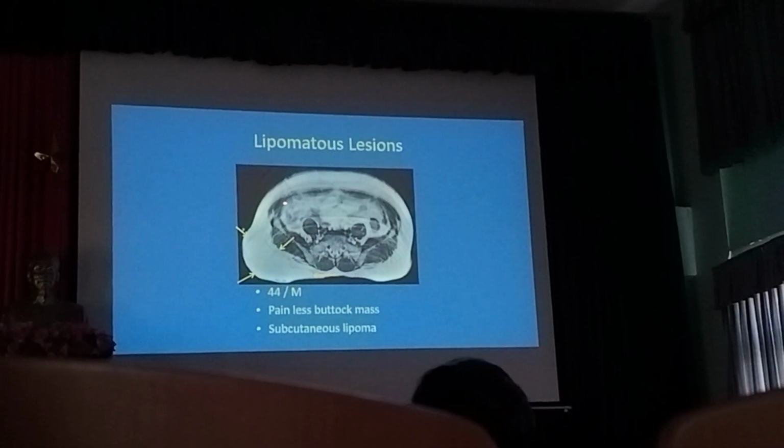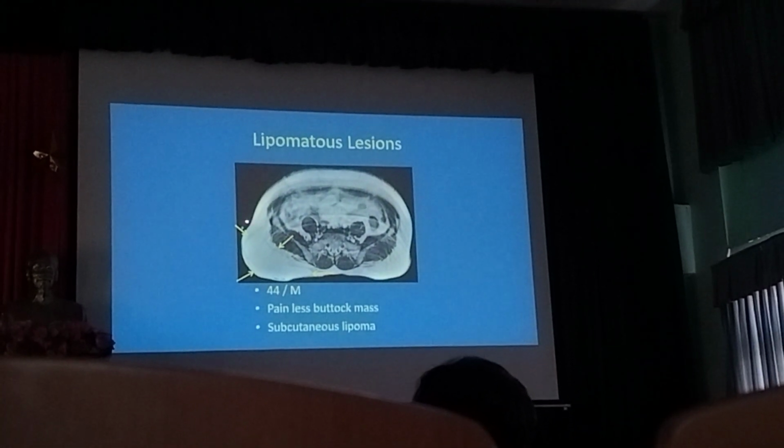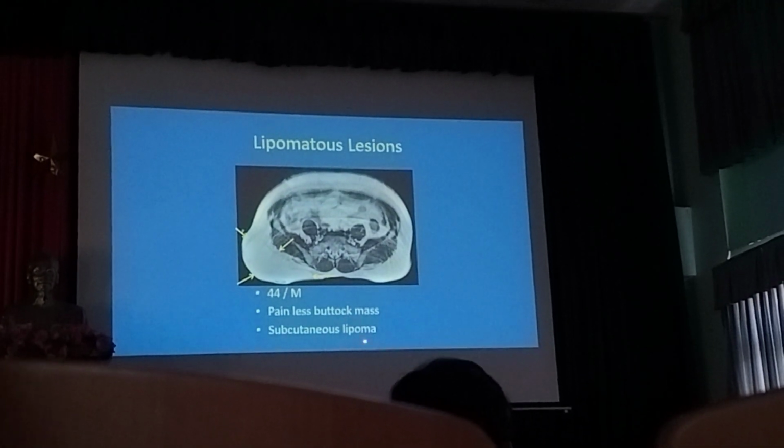Okay, and then this is the mass, which is on MRI. You can see this mass is similar to the surrounding fat, and it is a painless mass in the bottom. So this is supposed to be a benign lipoma.